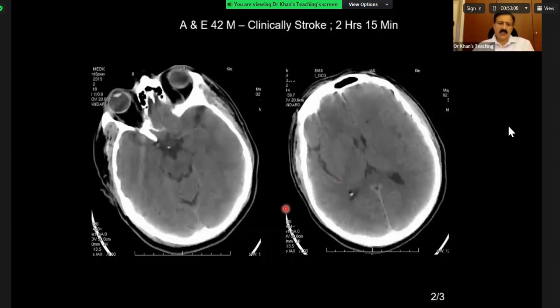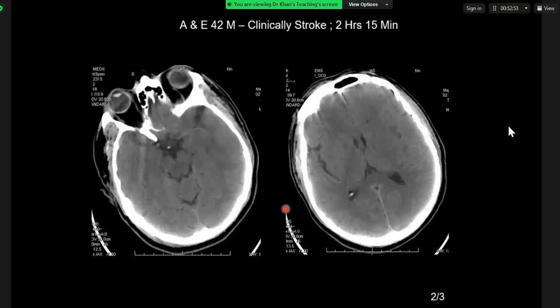In this particular case, is there an acute infarction? Now, we are going to quickly see a few cases of acute infarctions. Yes, and this is your last case, by the way. Okay. So these are 2 axial CT slices, and in the left MCA territory, there's hyperdensity, which is in keeping with a likely left MCA thrombosis. I don't see any current changes as yet, but I will look through the rest of the imaging to look for that.